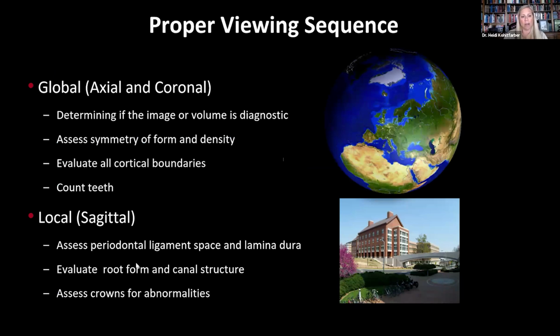The proper viewing sequence. Typically, I'll look at things more globally, and I can do that with my axial and my coronal sections because I can compare the right side and the left side with my axial and coronal sections. I can determine if the image is diagnostic.